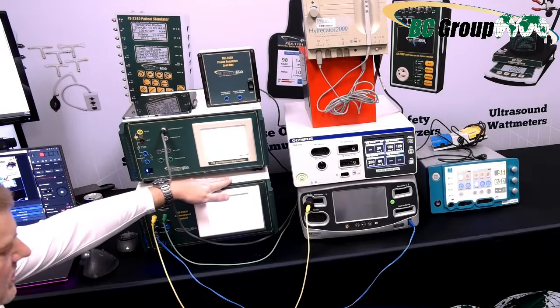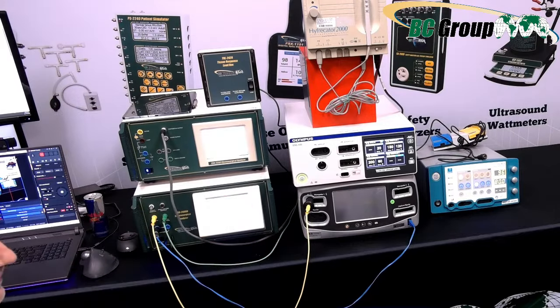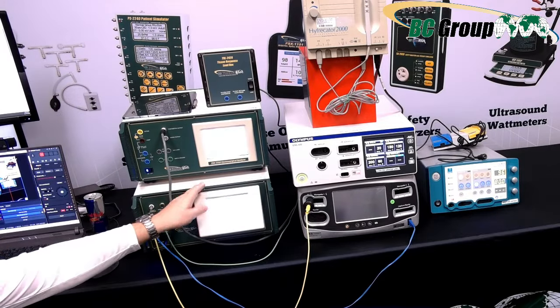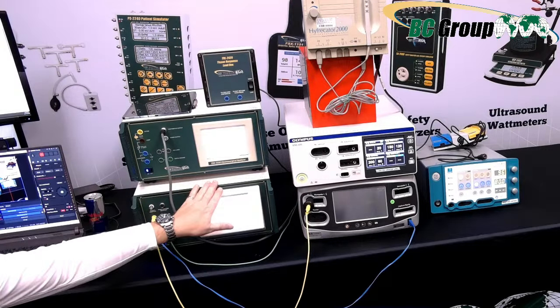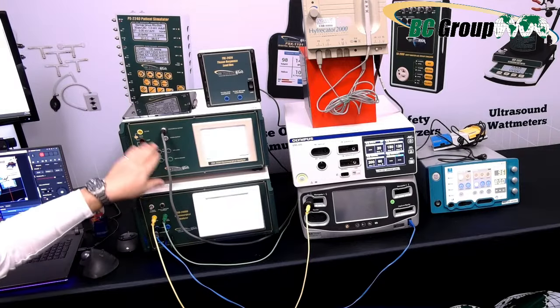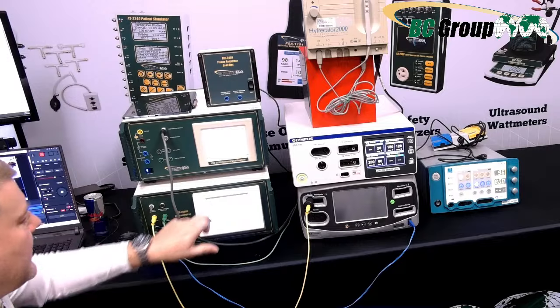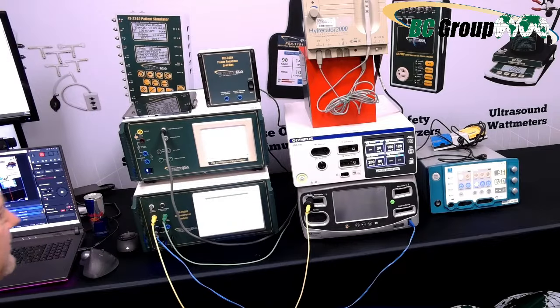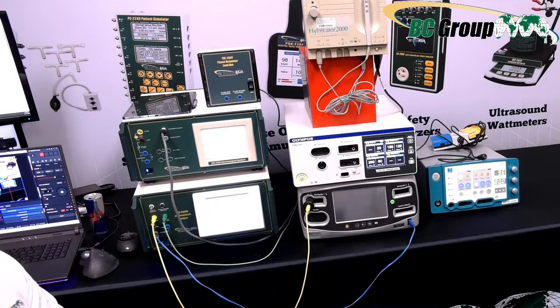So this unit right here is specifically designed to handle those high frequency bursts, and at the same time, we're going to go over a lot of the processes that are being automated inside the 2400 that you might have to do manually on the 2350 over here. And that's not taking anything away from the 2350. It's actually designed to be very transportable, lightweight, and easy to use, and we're going to cover that, okay?